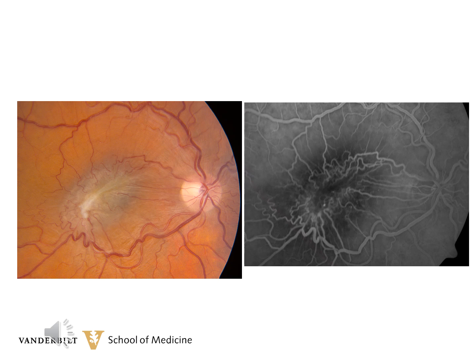The central gliosis blocks the fluorescein centrally. There may also be a little bit of hypofluorescence as the xanthophyll in the central macular area is bunched centrally as well by this membrane.